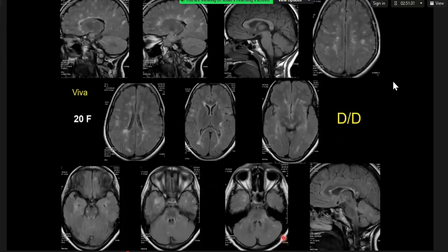I can also see one in the right, or bilaterally, in the medulla oblongata on the image on the left. Having a look, there's also some subcortical white matter changes. So findings would be in keeping with a white matter disease such as multiple sclerosis. I would correlate with the history. I'd also look closely at the eyes to see if there's any changes associated with optic neuritis, and refer to the McDonald criteria.